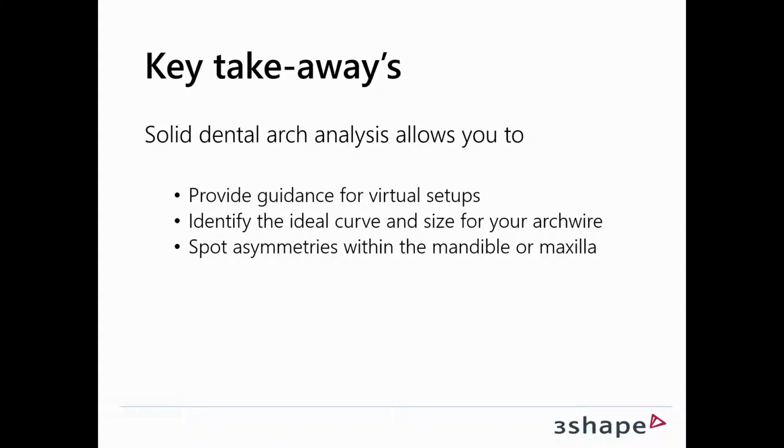So the key takeaways from this video are that solid dental arch analysis will allow you to provide guidance for virtual setups. It will allow you to identify the ideal curve and size for your arch wire, and it will also allow you to spot asymmetries within the mandible or maxilla.